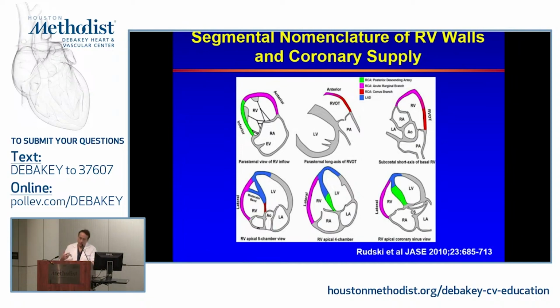All of that needs to be thought of if you're looking at a case with coronary artery disease and you're seeing problems, say, in the parasternal view, but not in the apical four, or vice versa. These could be the reasons that explain them. We talked about the moderator band briefly. It gets its blood supply from the left anterior descending coronary artery, sometimes from one of its septal branches. And why is that important? Because if you're doing alcohol septal ablation cases, sometimes these septal perforators supply the moderator band, and you can see the moderator band lighting up.